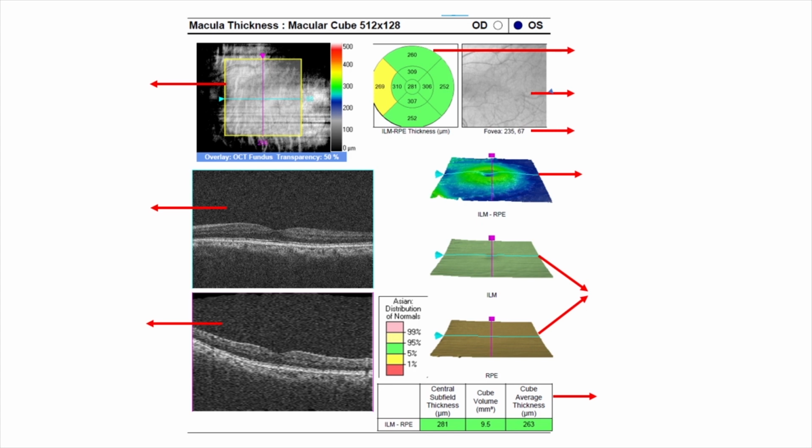So that's the coherence between them. They've written there, overlay. That is the overall OCT fundus. So it's an SLO, OCT SLO scan. What you see is the OCT reflectance image. The OCT, what you see, it's not a photograph. The Topcon used to have it, but this is not that. This is an image which is made up from the laser reflectance. So this is the SLO OCT scan that you see.